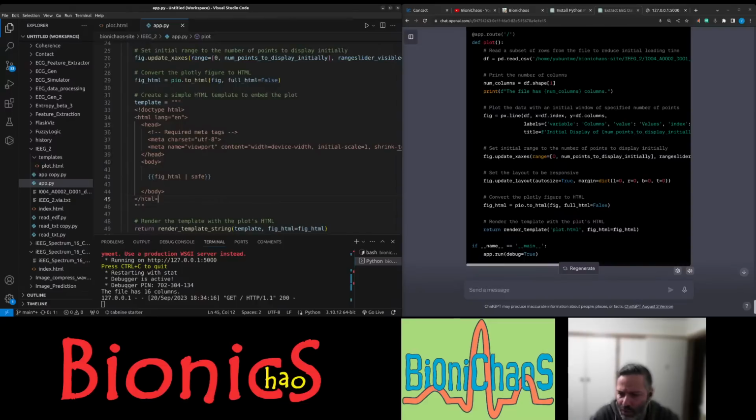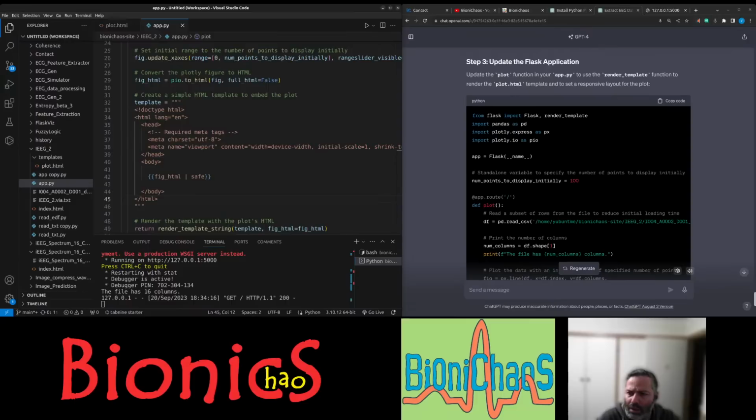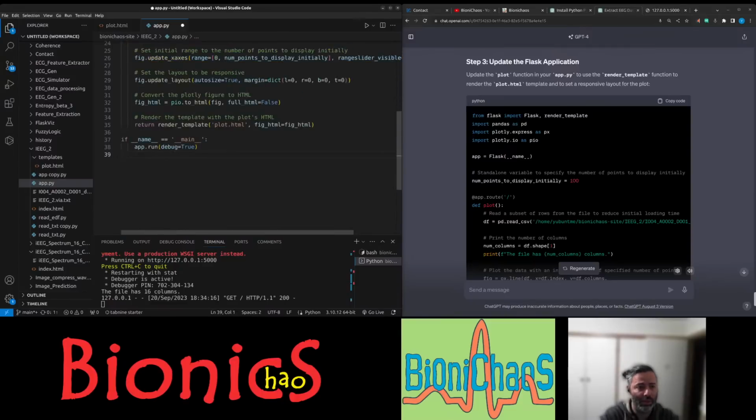Okay, is this the whole file? What's the size? That's great. Just starting, so can't get worse than what it is. Still in debug mode.